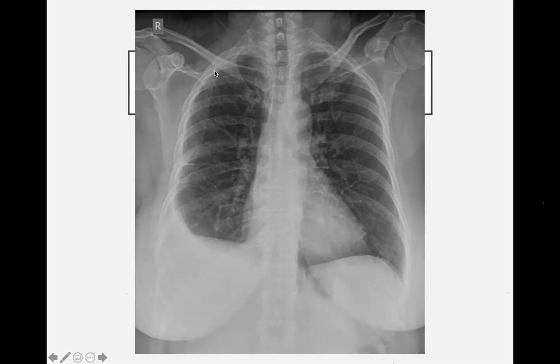We've got an AP X-ray because the scapulae can be seen well behind into the ribs behind the lungs. So AP X-ray. Don't know any of the patient details or anything like that. Guessing it's a woman. Okay. Rotation. I'm looking at both the scapula, both the clavicles, and it seems in the middle. Yes. Is that okay? Okay.